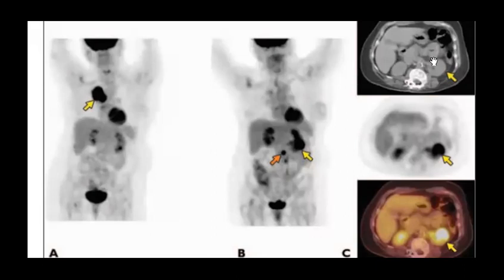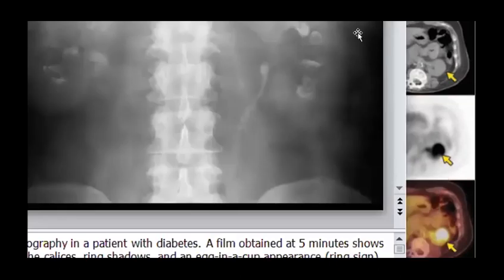So this is a left renal mass, which is metastatic. Okay, for this patient, your suggestion would be lung cancer, and you can see the lymphadenopathy and the kidney involvement in this case. Okay, let's come back.